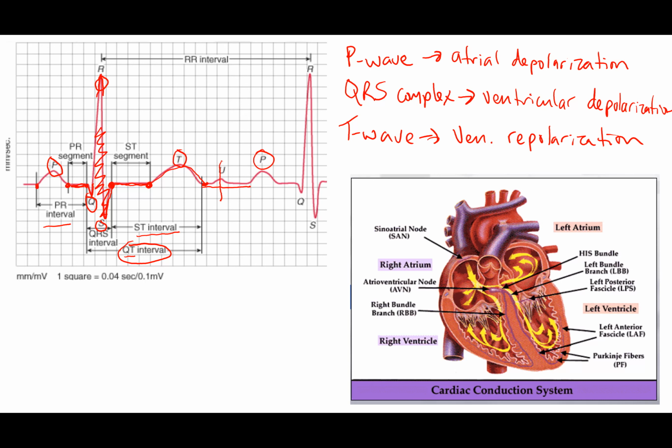So you see on this ECG, we've got vertical lines, and then we've got some horizontal lines, right? The horizontal lines give you amplitude, kind of tell you the strength of the electrical signal, at least relatively speaking, not necessarily on an absolute level, but relatively. And then the vertical lines give you time, and we'll talk about that when we start talking about rate. But you're going to measure time by counting these vertical lines, or what we might call these boxes. Each box is a certain amount of time. And you can see down here, it kind of gives that to you.